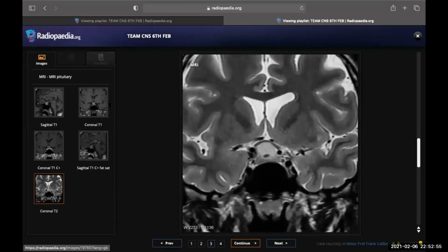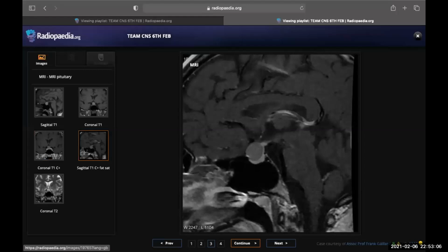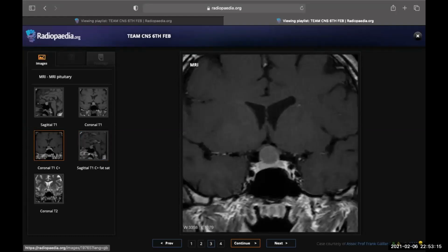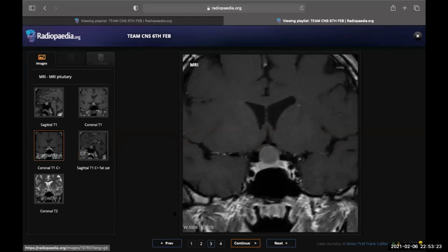Okay. So it's the relation, the gland itself, it is compressed down. Excellent. Yes. So I'm ruling out the macroadenoma. Okay. So what are you left with? The enhancement is peripheral. I'm thinking of Rathke's cleft cyst. Okay. So we are going to the next case.